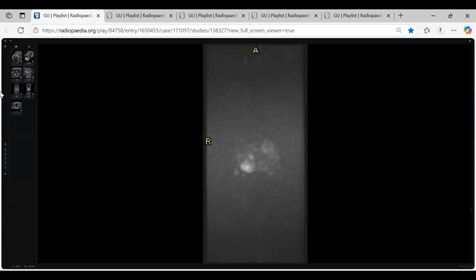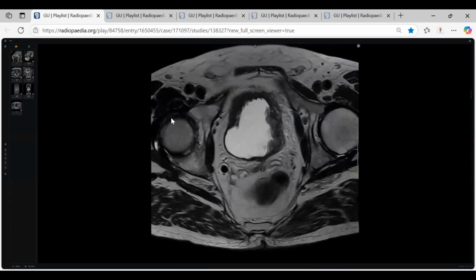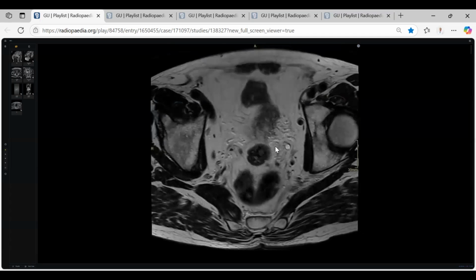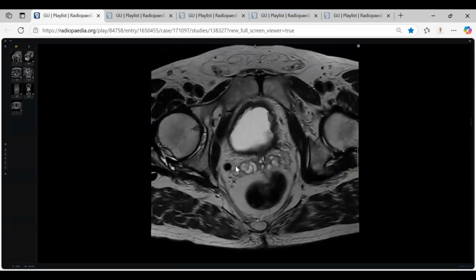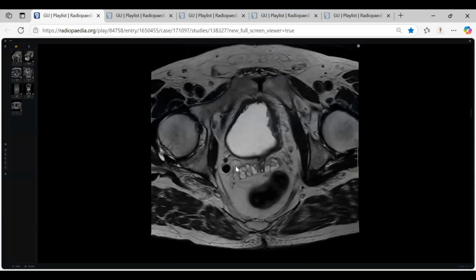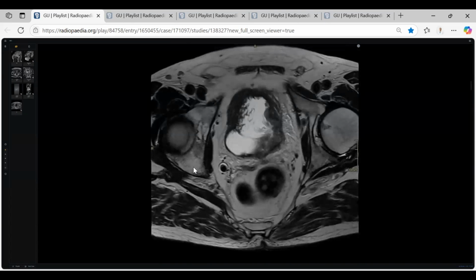Excellent. Final diagnosis, please. A case of carcinoma of the bladder and... I'm not sure. Is this a concomitant diagnosis, or is there some spread? It doesn't seem to be spread. Why? The spread from the prostate should first go to the adjacent seminal vesicle and the bladder base. This is at 4, 5, 6, 7 o'clock, at the posterior part of the prostate, so it must invade the seminal vesicle and ejaculatory duct first.